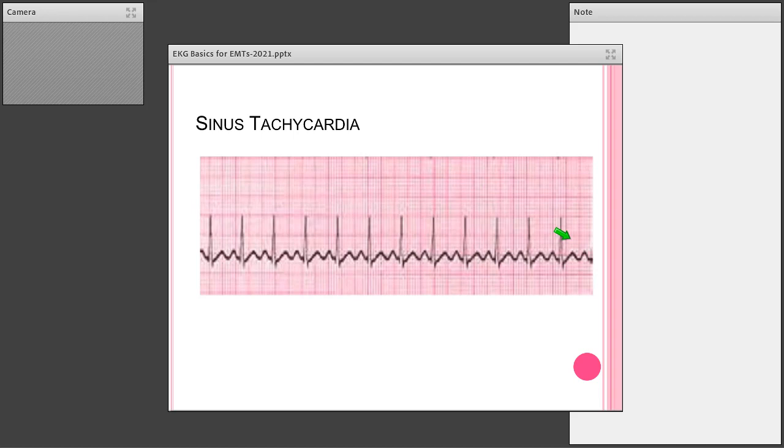And if we wanted to do it the other way, just for fun, this one pretty much starts on a heavy line. So we go back 300, 150. This next one's 100. So we're somewhere between 100 and 150. So about 120. It's a little bit heavier to the 150. So somewhere between a heart rate of 120 and 130.